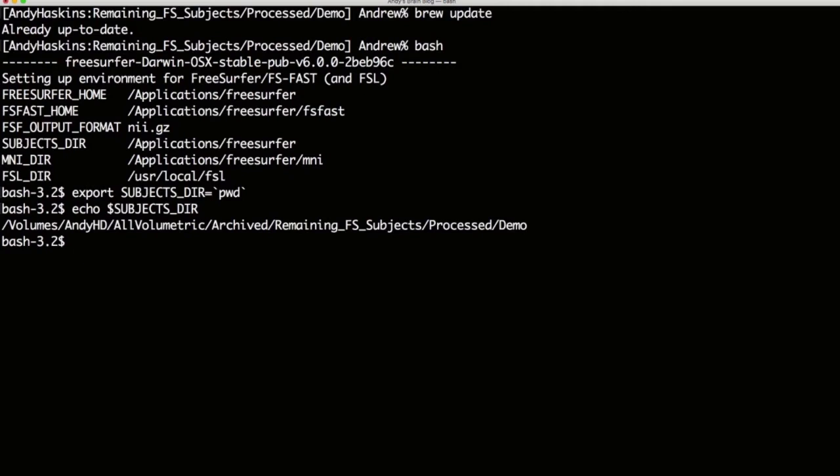To run several jobs simultaneously in parallel, we will pipe in the subjects using the vertical bar. From the directory containing all of your anatomical Nifty files, type the following: ls *.nii, vertical bar, parallel --jobs 8, and then recon-all -s, braces with a dot inside, -i, empty braces, and then the options all and qcache.